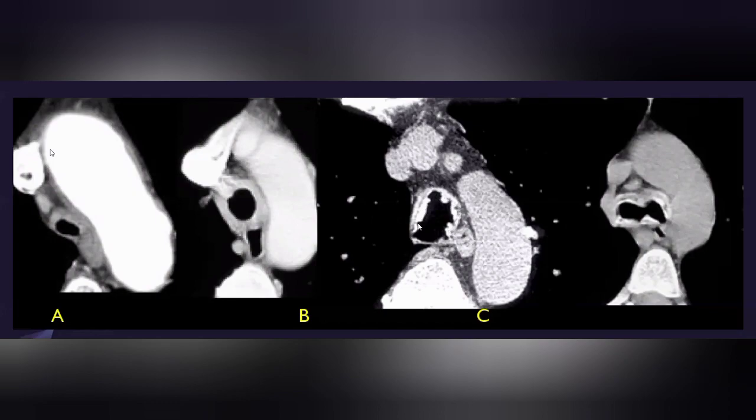C case you already know, which I've already shown you. This is tracheobronchopathia osteochondroplastica. The middle case again shows diffuse involvement anteriorly as well as posteriorly without any significant narrowing of the lumen or any mucosal lesion. The mucosa is very smooth. And if I say that this patient also has sinus disease and renal failure, then it would become granulomatosis with polyangiitis. Exactly. So similar appearance, diffuse involvement anterior and posterior both, and bronchi involvement as well. And some calcification, but the calcification is more amorphous and diffuse, not like nodular chunks like this one.